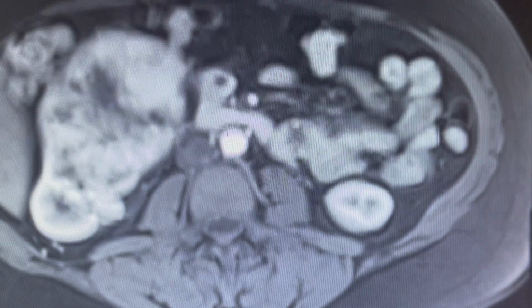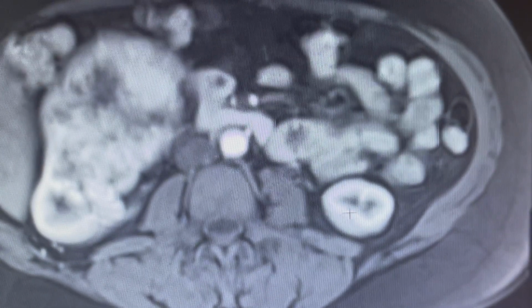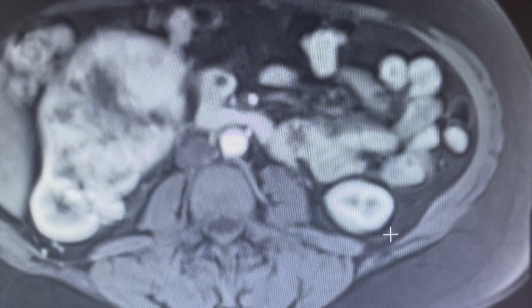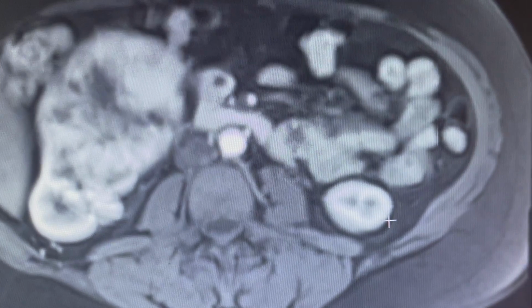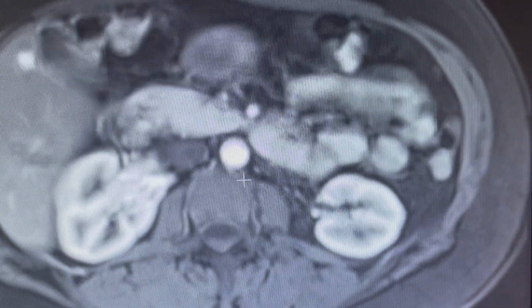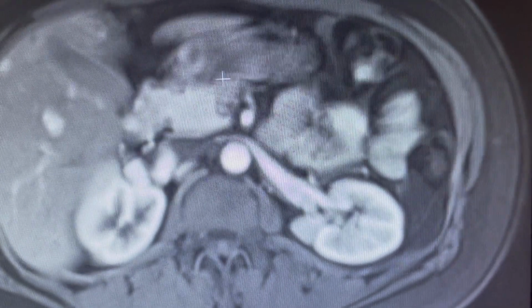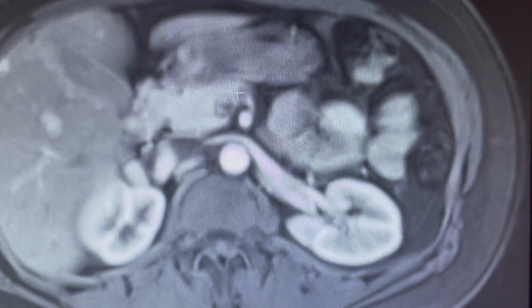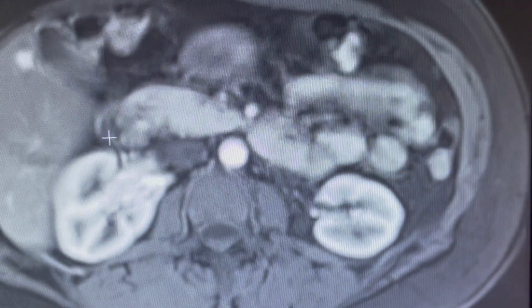Now this level of enhancement almost approaches that of the aorta and certainly approaches the signal intensity of renal cortex. This is a normal left kidney, and I use kidneys as a reference point for enhancement. We're coming up more superiorly, looking at the stomach enhancement. It's a little bit heterogeneous, but doesn't look so impressive.